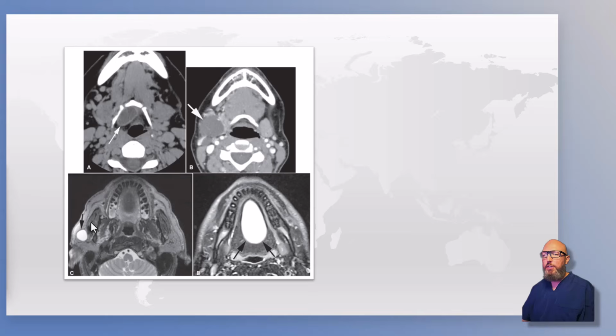And this is the masseter, and so we have the parotid gland. This is a cyst-like thing right in the middle of the parotid gland, and we talked about this in the salivary gland lecture. This is a lymphoepithelial cyst. So this is a little bit further up than the branchial cleft cyst, more in kind of the facial tissues, just behind the masseter and right in the parotid gland.